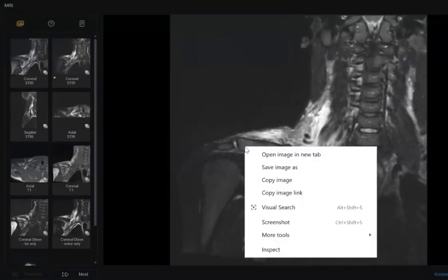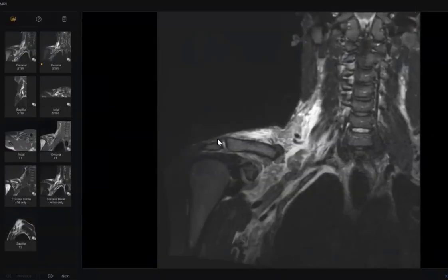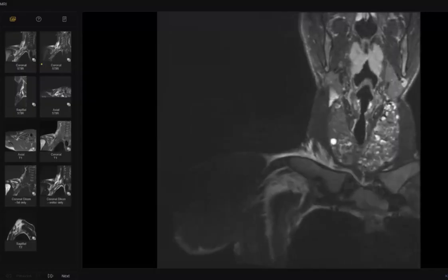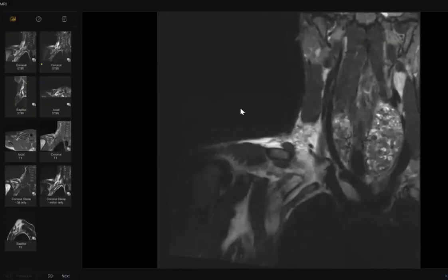Post-traumatic patient with right shoulder weakness. Sir, I've requested control. Yeah, go on. Sir, it's not scrolling. Will you please hold for one second? You can use the arrow. Okay, let me scroll for you.